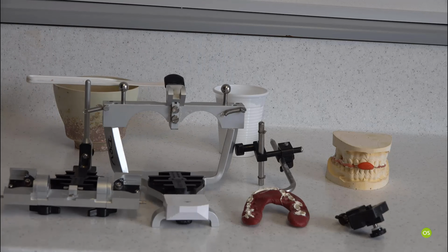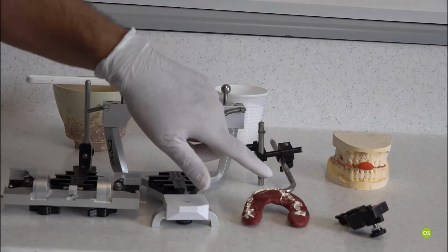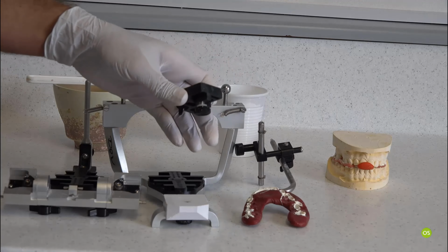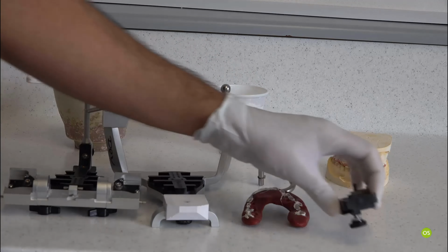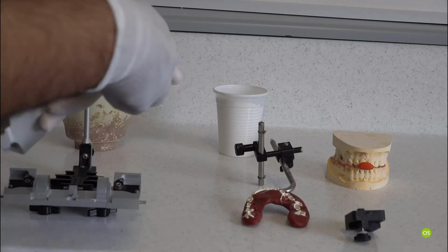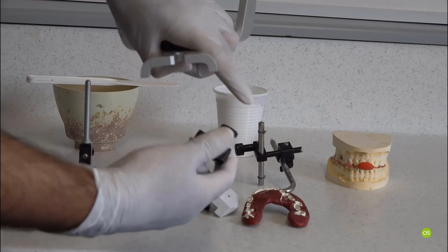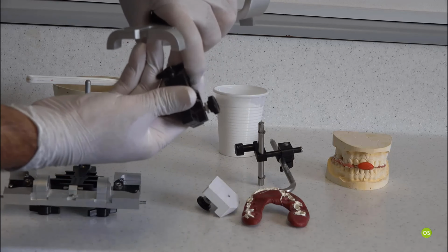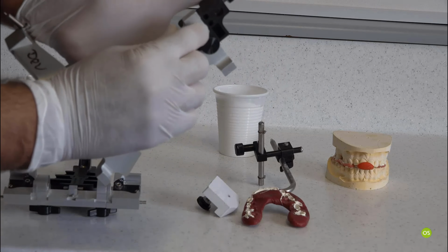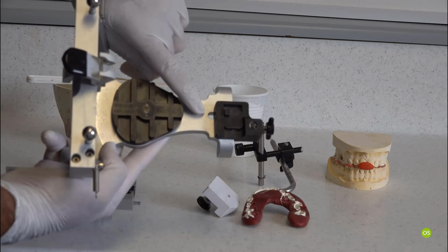Now once that's done, you will obviously need your maxillary and mandibular models. You have your Facebow. Now this is a mounting table which you will need in order to use a Facebow to mount the model. So what you need to do is remove the normal table here and put the mounting table. This part here, you can see, goes into it. Make sure it's seated here completely, because here it doesn't look like it's seated completely.